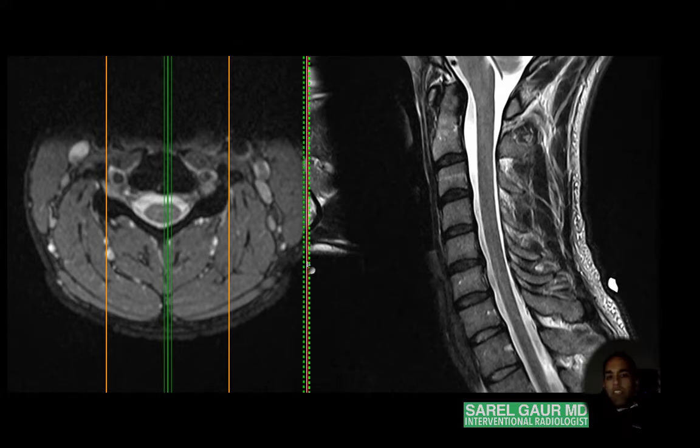Because if you look at all the other stuff, you're going to lose your focus and you're not going to make the important findings. So really you want to focus on looking at the cord, looking at the column, looking at how they interact, and diagnosing disease. And keep in mind that these structures interact in a very specific way.